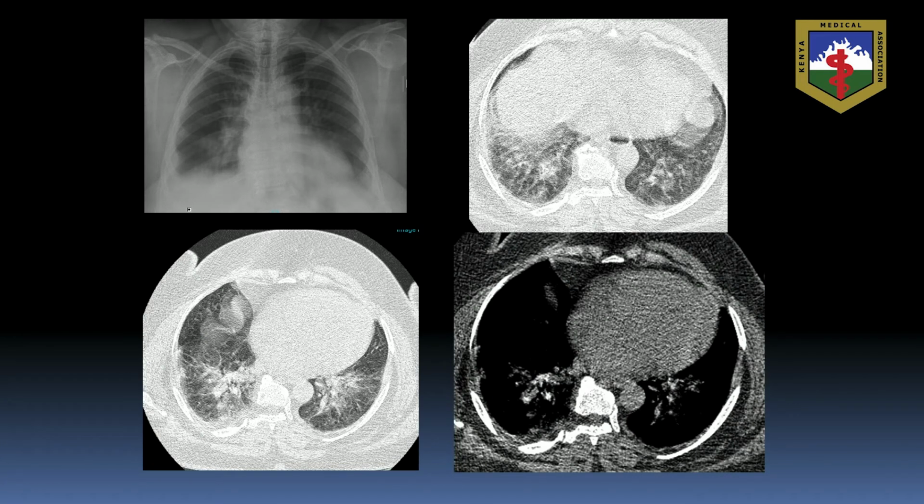Now, this is a local patient case where you can see from the top the ground glass opacification, which is both perihilar and peripheral. The patient then had a CT chest done, and you can see the lung window where you're getting ground glass opacification. You're already beginning to get interstitial thickening.